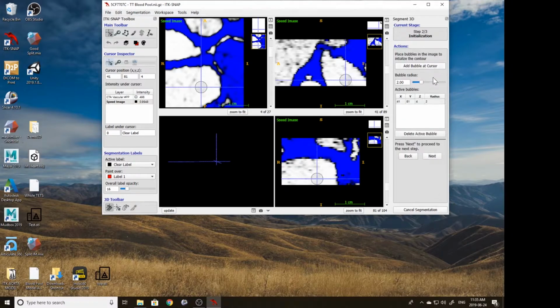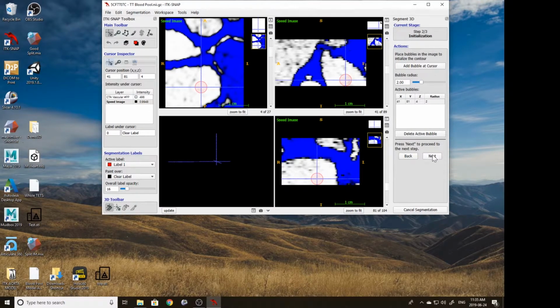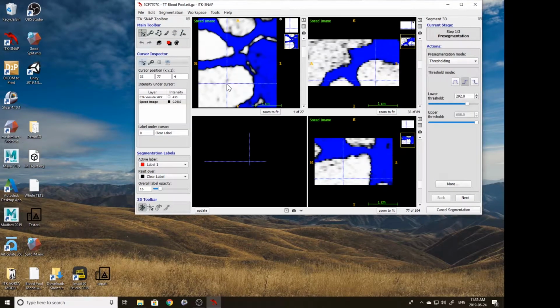So again, creating that bubble. Now here I had the wrong label because I had it from when I was doing the erasing. So you can go through and swap that back over. There are quick selection ones, and sometimes they work for you. Otherwise, you'll have to go in and do that by hand yourself.